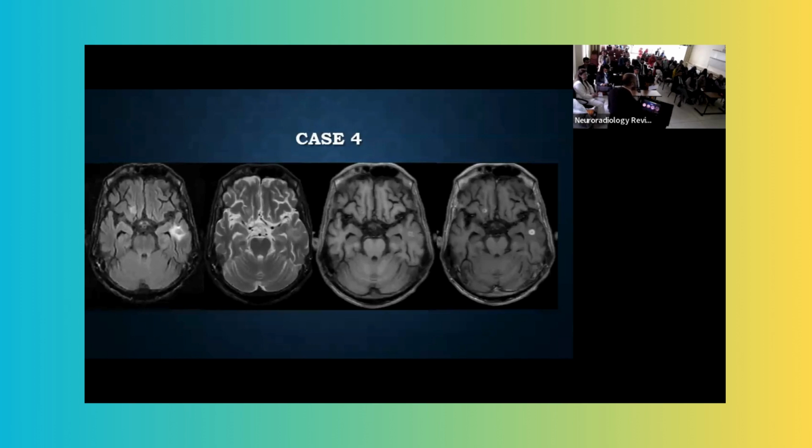But this is a stage where this is actually a caseating situation where this is causing some reaction and there's edema around it. And you see this typical thing here. What you see is a low signal overall lesion. There is some internal high signal change on the MRI scan, which suggests that it is developing into liquefactive necrosis. So if it becomes bigger, it can develop into an abscess, okay?